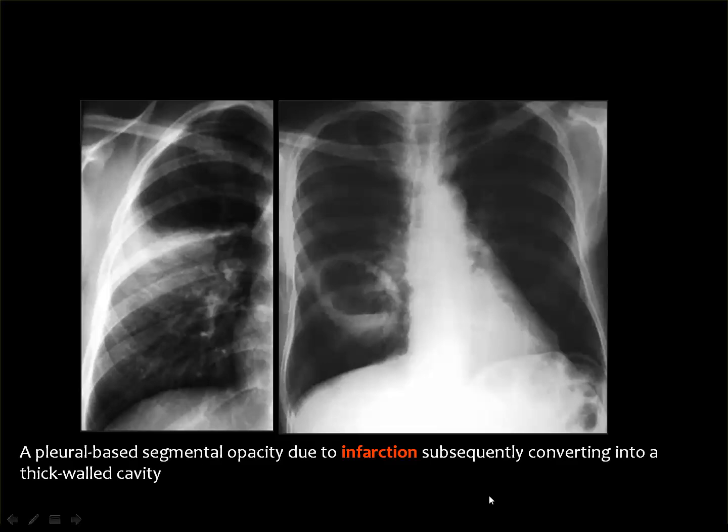And this is a pulmonary opacity which was secondary to pulmonary embolism, meaning that this is an infarction. And the infarction, as you remember, looks exactly similar to the pneumonic consolidation in the chest X-ray. Both will show air bronchogram. Both will be associated with pleural effusion. But it is the history and maybe the CT pulmonary angiography that can differentiate between pneumonia and infarction.